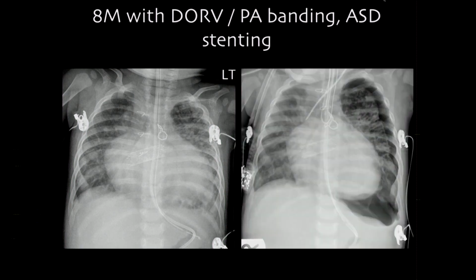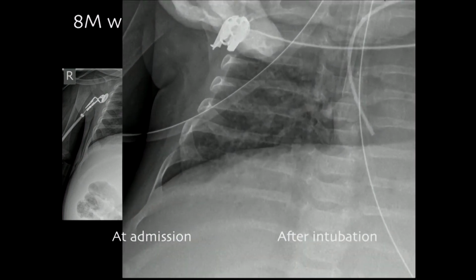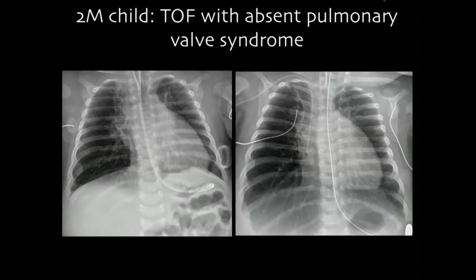One day later, you have more findings of interstitial emphysema, and the patient has developed a pneumothorax. Okay, so pulmonary interstitial emphysema in the ICU. If we have this unusual tubular lucency, not even in caliber, that is almost diagnostic of pulmonary interstitial emphysema. Okay. So this is a case with an abnormal airway. If I blow up here, you see that the ET tube is too far down in the right main bronchus, okay? So abnormal location of the airway.